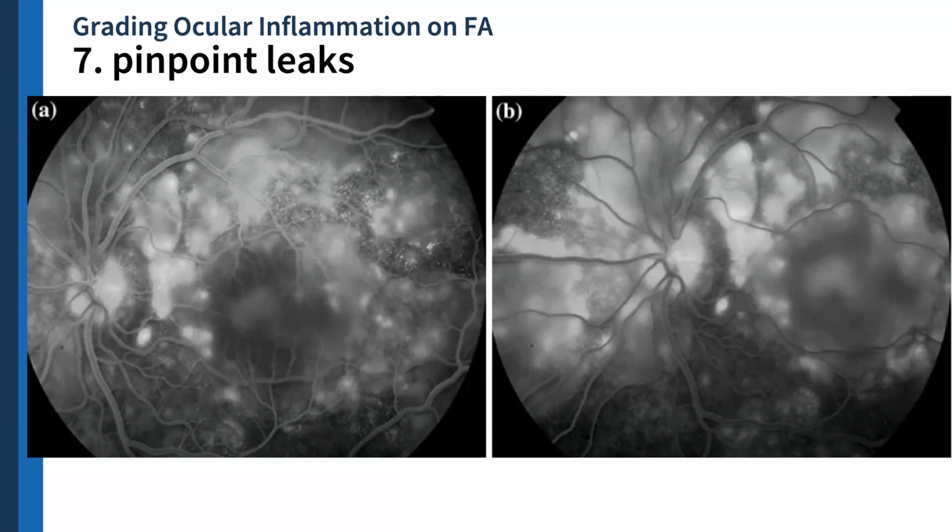how can you differentiate this angiogram from VKH from multifocal CSR? Sige, yun. Pwede, unilaterality. But just by looking at the angiogram, what makes this more VKH rather than multifocal CSR? Kasi pwede din, multifocal CSR will present in exactly the same pattern. So there's a pinpoint leak, and then there's pooling in the area of the exudative retinal detachment.